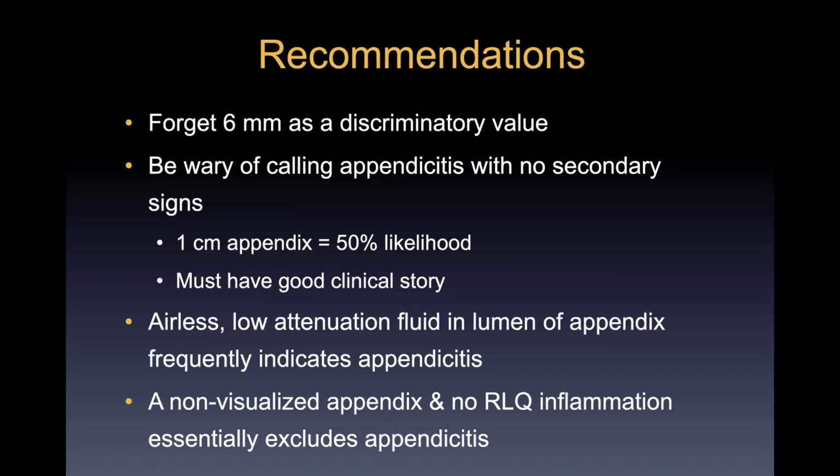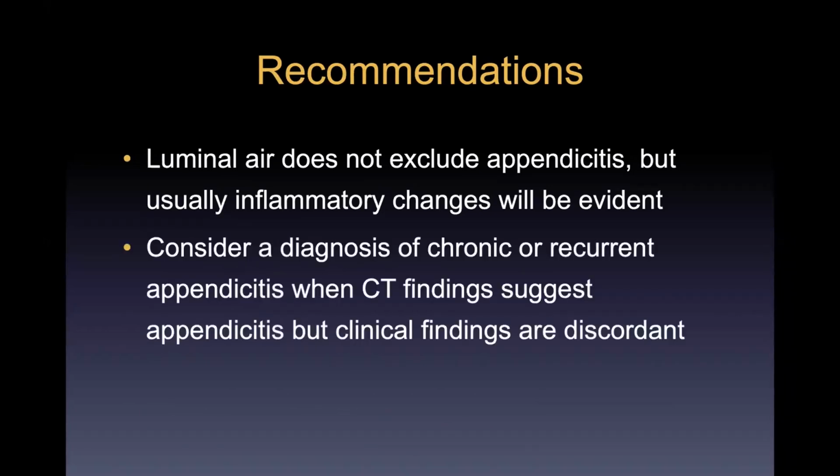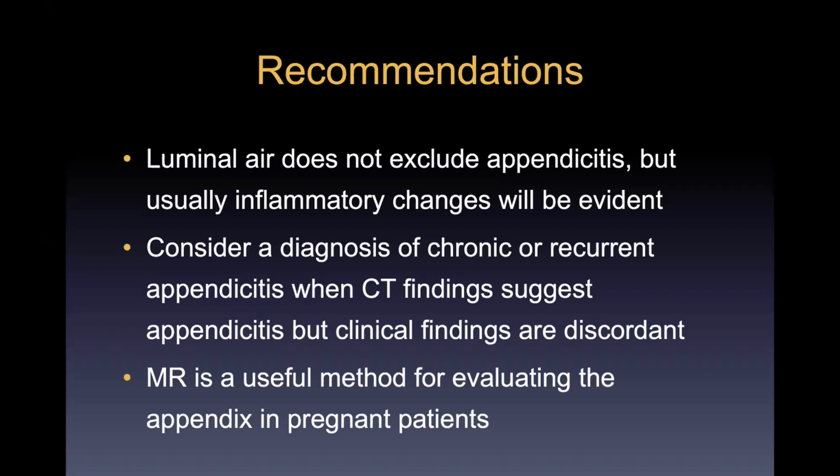Remember that if you do not see the appendix, but there are no inflammatory changes, you've essentially excluded a diagnosis of appendicitis. Luminal air, probably shouldn't use it. And then consider a diagnosis of chronic or recurrent appendicitis when CT findings and clinical findings are discordant. And lastly, remember MR in the pregnant patient.